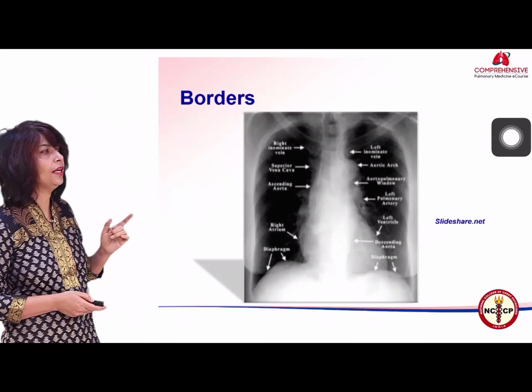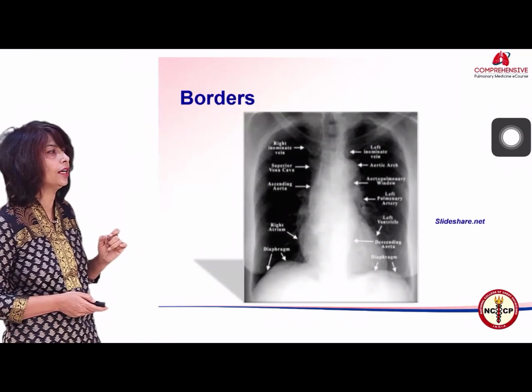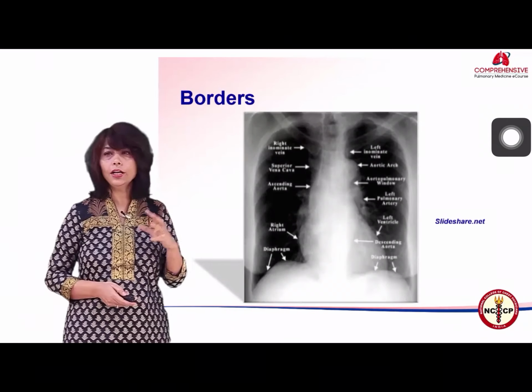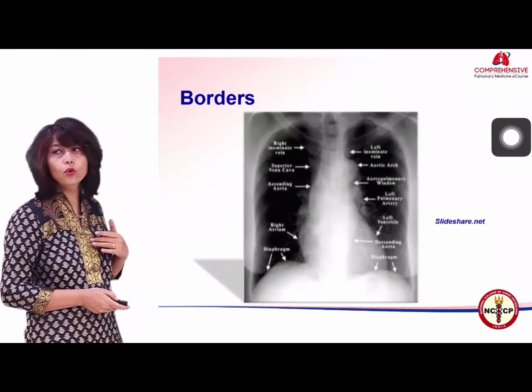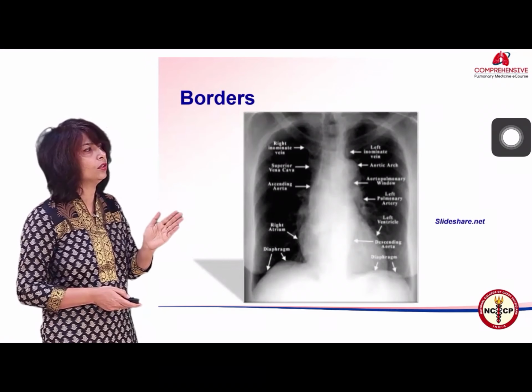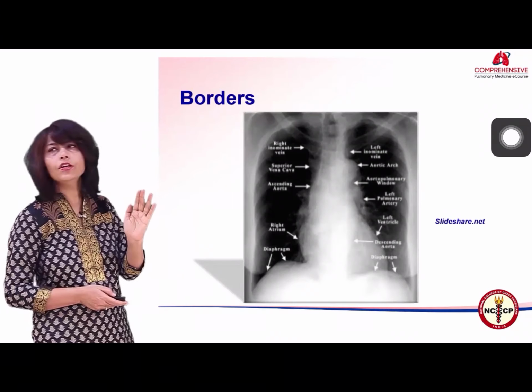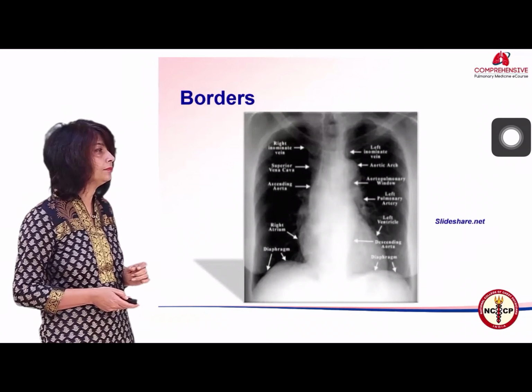Above the pulmonary bay, bulging outside towards the left lung is the aortic arch, and between the aortic arch and the LPA is the aortopulmonary window, a very important location for nodes from our point of view, because subtle nodes coming in tuberculosis or sarcoidosis may simply fill this aortopulmonary window out and you may miss the abnormality.